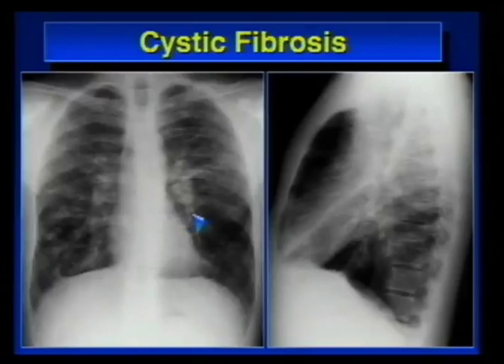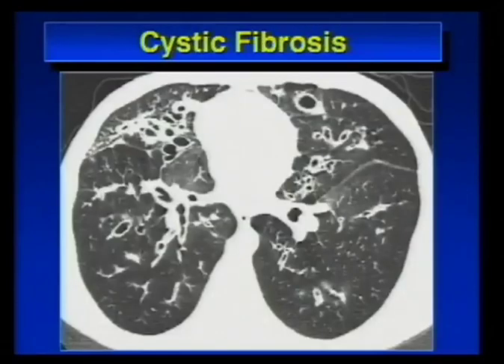Unfortunately, it's not projecting as well as I would like, but there is cystic bronchiectasis up here. It looks exactly like a boards case, right? It's way too dark for you to make a diagnosis. Okay, well, this is what it looks like on the CT scan.